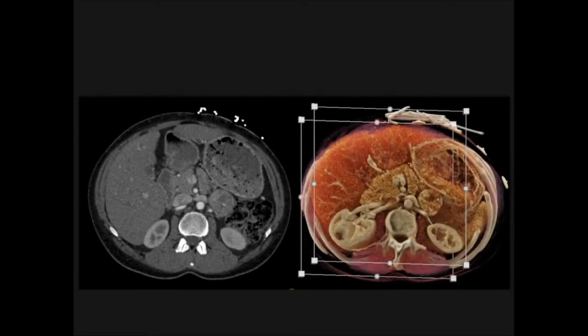The least likely diagnosis in this case of an incidental adrenal lesion is, well, typically when you look at a lesion, it's an incidental finding under 4 cm, it's almost always an adenoma. Pheochromocytomas can also be presenting. More pheos present incidentally than as hypertension. And in fact, this case eventually was proven to be a pheochromocytoma. This is not the appearance of adrenal hemorrhage.